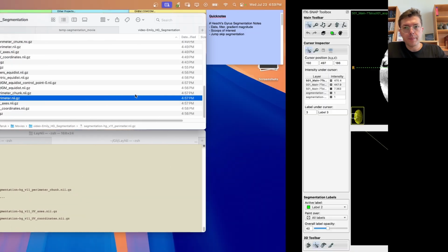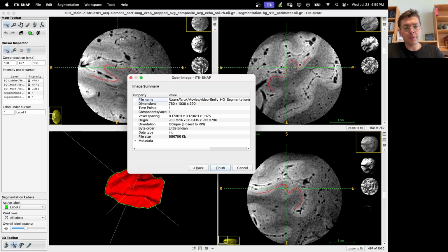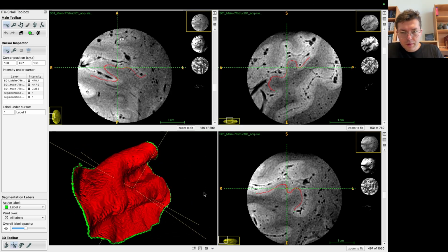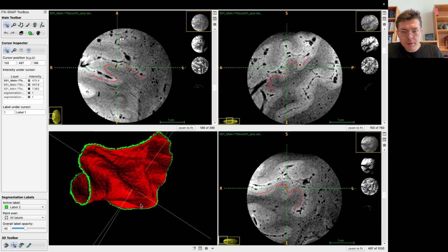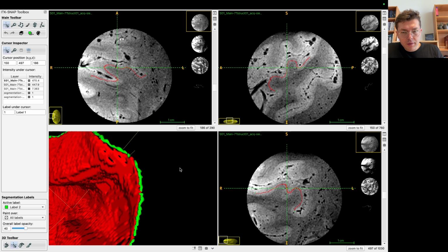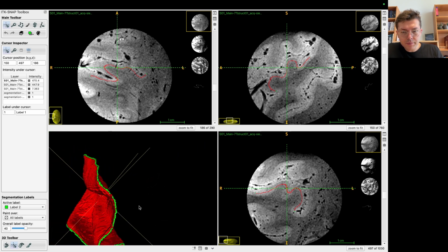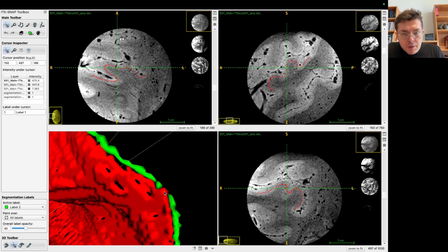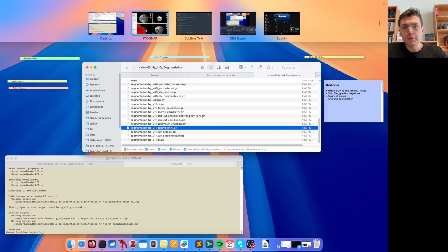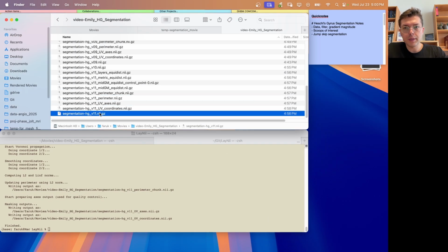Okay. Now let's load it as a segmentation as well for me to see. Maybe I missed there was a discontinuity. So this part looks fine. This part looks fine. Yeah, maybe there. Look, there's one voxel wide gap. We were almost there. We almost did it. Okay, fine. Which means that we just need to polish a little bit the segmentation, which was 11.